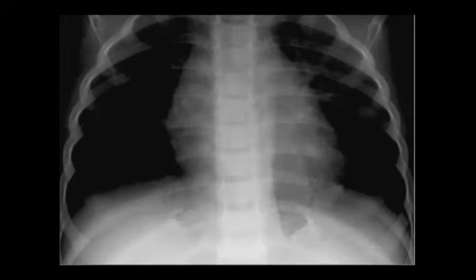Maybe, yeah, I wait for something else. Can you go further and try to find more? Yeah, perfect. So maybe there is some adjacent dense vertebrae, yes, and the paraspinal line is widened. Here, do you see here or here?